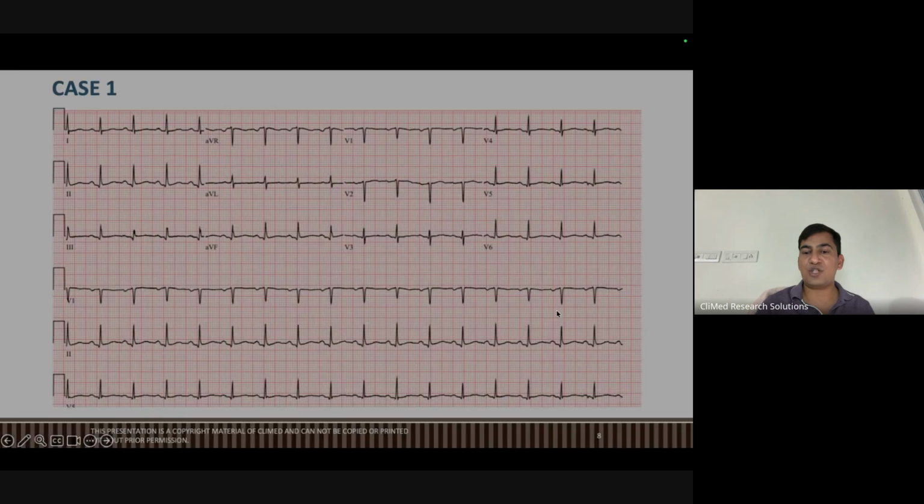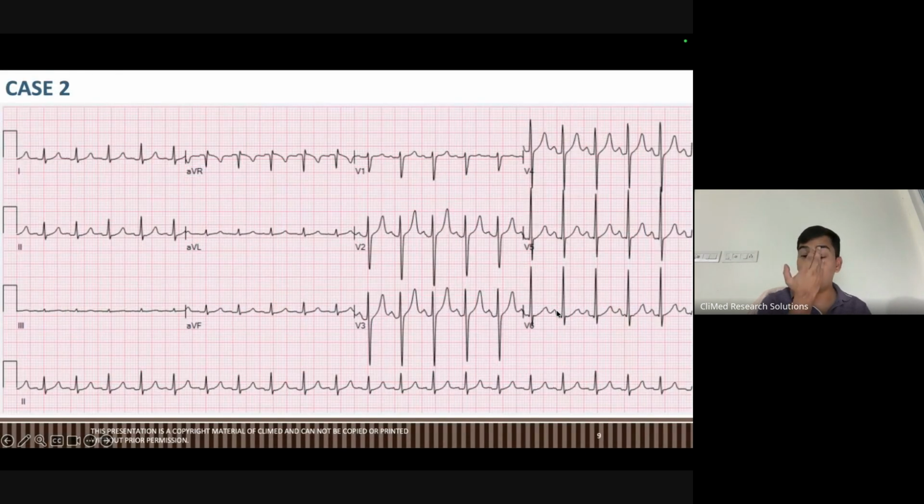Now there is case number two. Case two, guys. Tell me what is this?